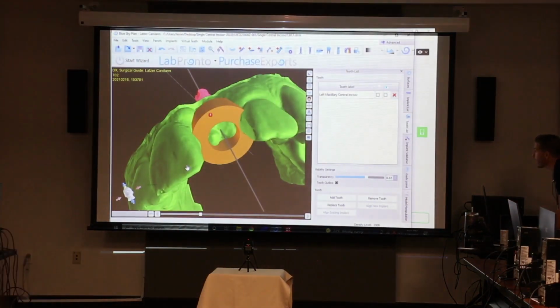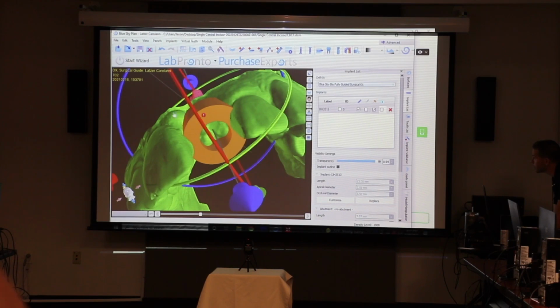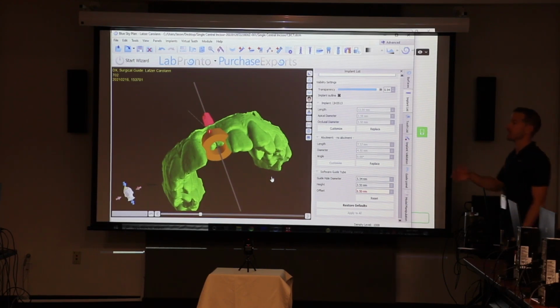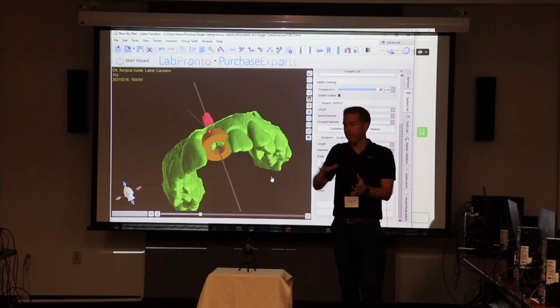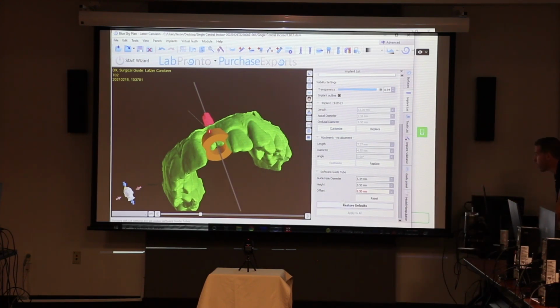And so I have in here planned a 13 millimeter implant, okay? So I want to go and increase this guide tube. Now, let's talk about how much we want to increase that. If we were going sleeveless, remember we got to go to 8.5. What if we want to do sleeveless and increase the offset to the next drill? We've got to increase it the next drill length. So right now we had a 13 millimeter implant placed, right? Well, what's our next size drill up past 13? It's the 16, right? So if I wanted to stick with the blue sky drills and extend that higher away, I can move to that 16 millimeter drill. So what do I have to do? Add 3 millimeters to my offset. So in that case, I would take this from 8.5 to 11.5.